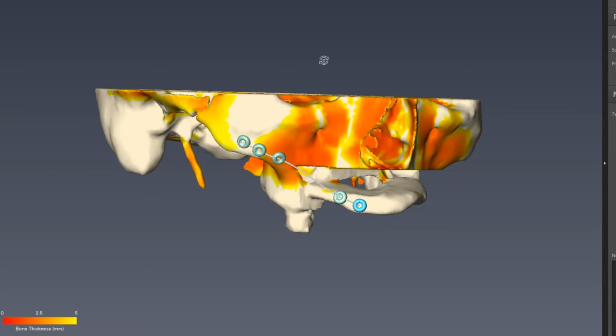And you only want 2 holes on either side, or do you want 3 on the native? We'll have 3 on the zygoma. It's fine because we can get to it. Okay. Just thinking practically.